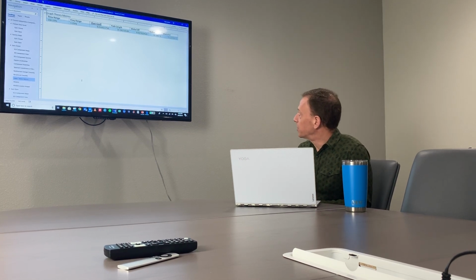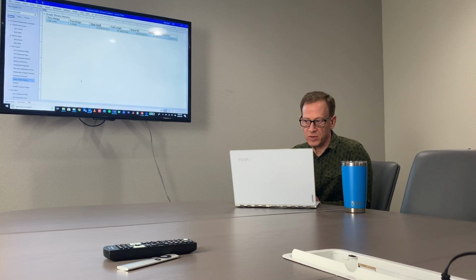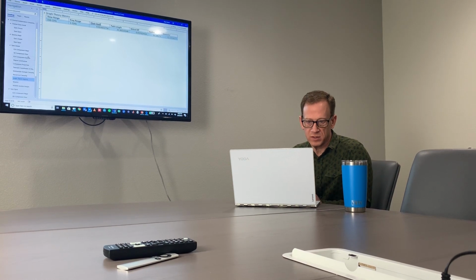A healthy path length would be under 20 or so. Okay? So that tells us that hers is higher, or less efficient, than it should be. We then break that up into radius and diameter. Radius is a 31. Radius is the efficiency of the shortest connections, and diameter is the efficiency of the longest connections. So that tells us that her diameter is much worse than her radius.